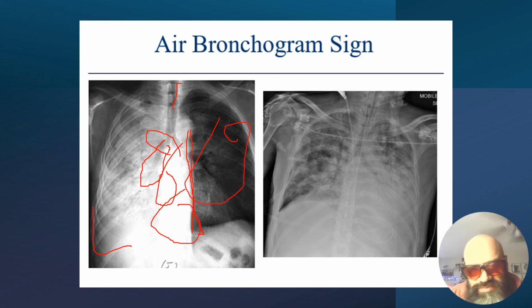So these are examples of alveolar infiltrates. You can see it's fluffy, it's loculated to the right area, and the rest in the base of the lungs is mostly pulmonary edema. You can see here in the left lower region, we've lost the costophrenic angle on the left side. That means that fluid is basically taking up space in that entire area and collapsing the lung eventually.